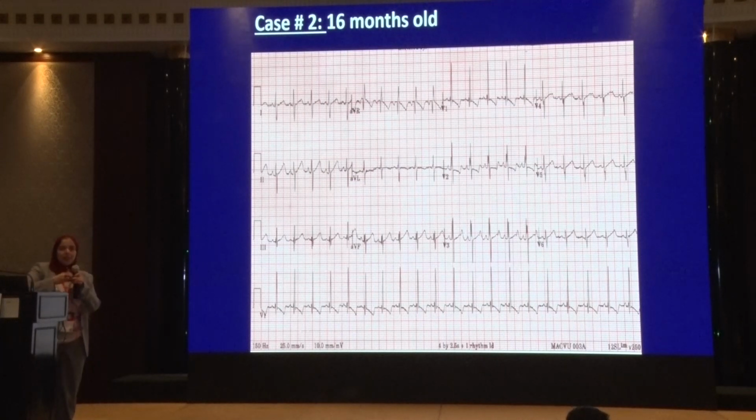Okay? We will start by the limb leads. First thing is the rate. Yeah, around 300 divided by 2.5. Yeah, something like this, okay?